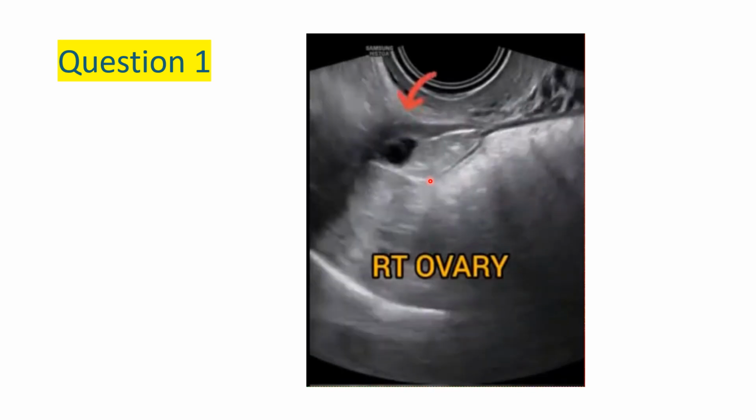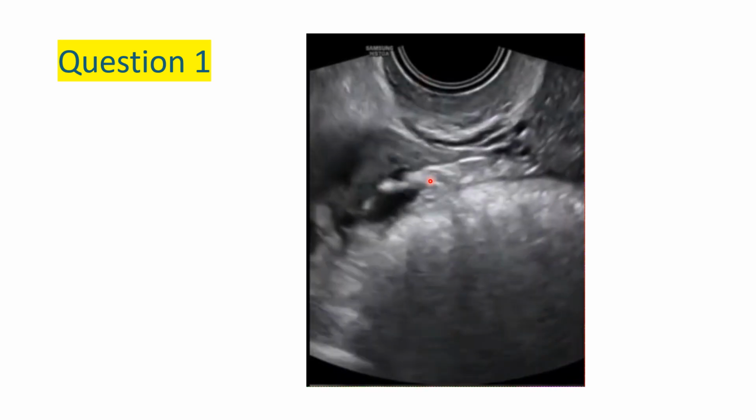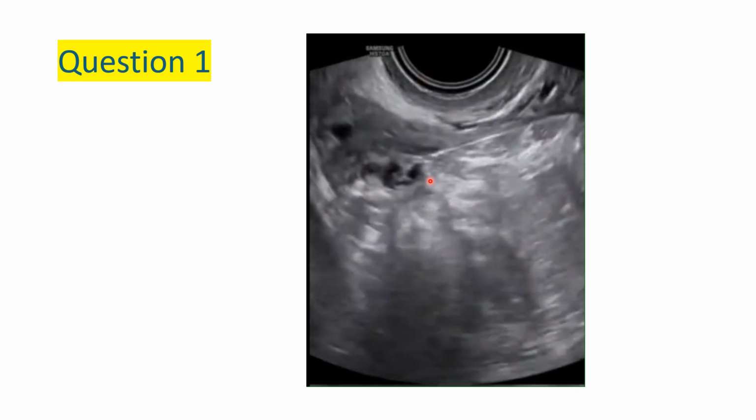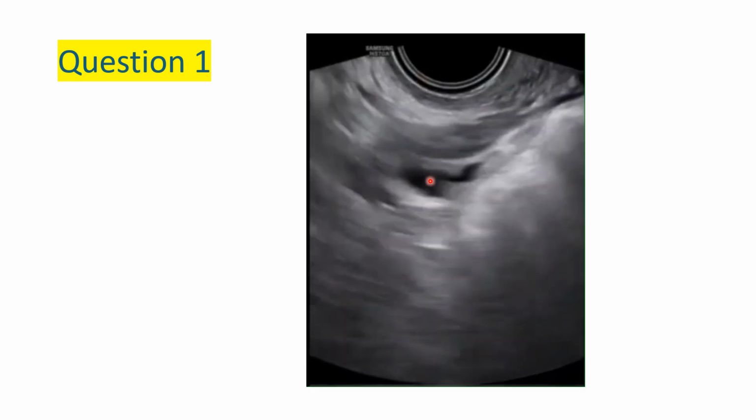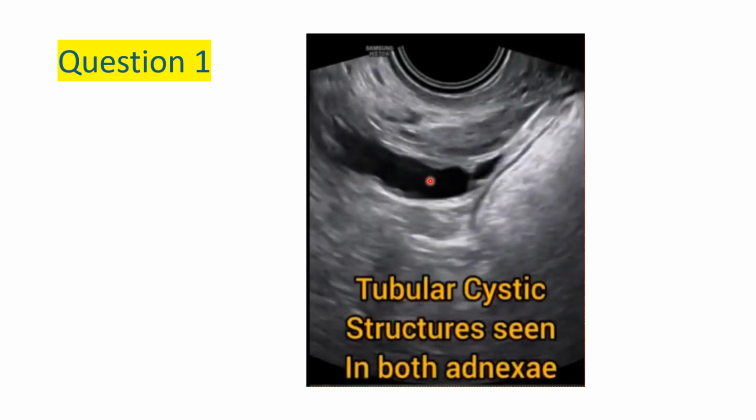So this is in keeping with hydrosalpinx. So this is bilateral hydrosalpinx. So if you were thinking about hydrosalpinx, you are very much 100% correct. So what is hydrosalpinx? Hydrosalpinx is fluid collection in the fallopian tubes.